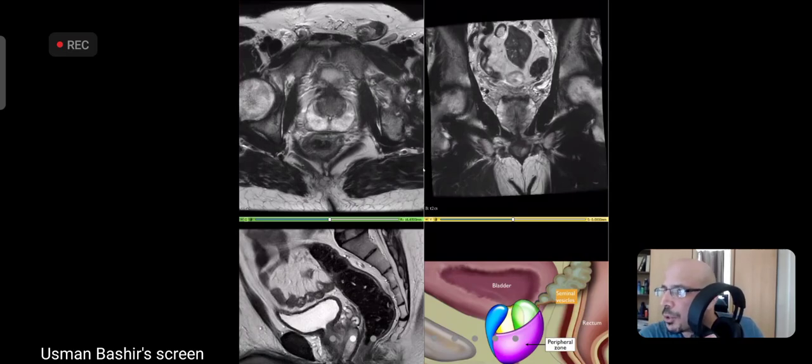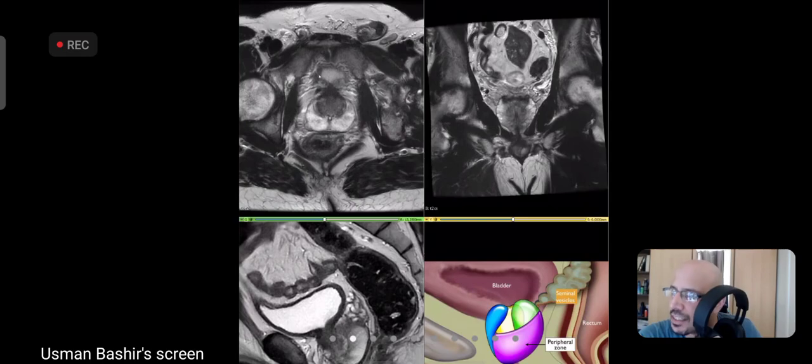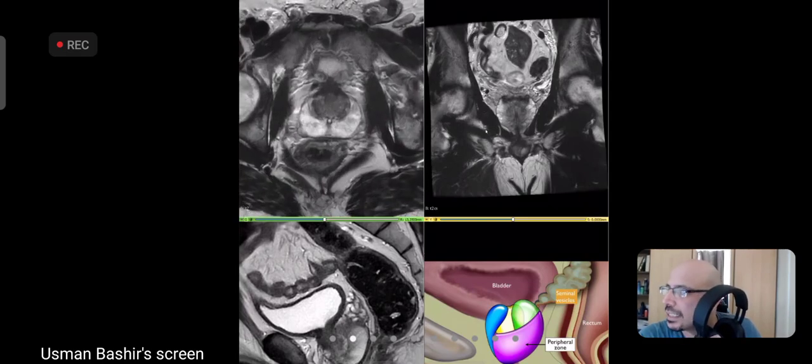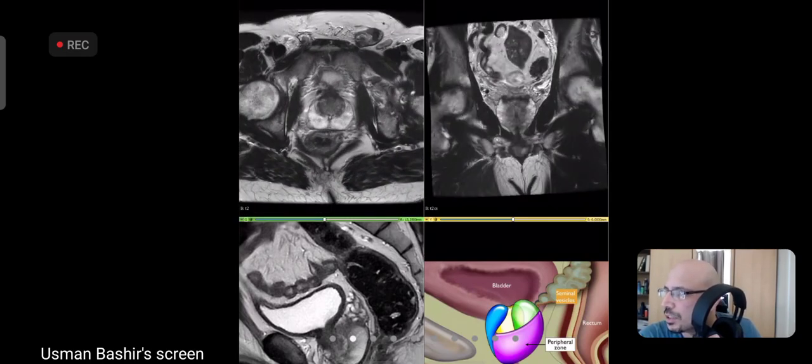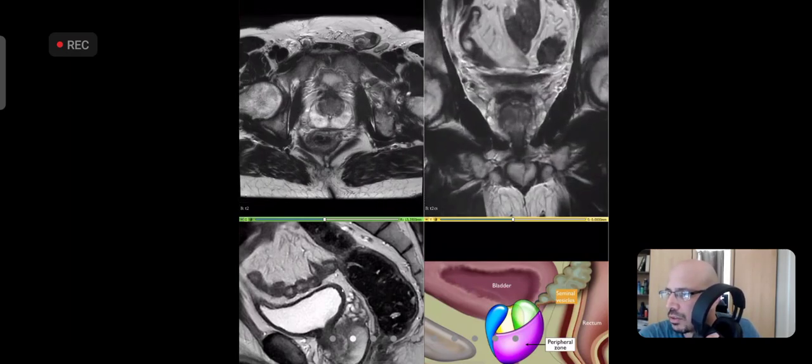Okay. So ये picture में ज़बरदस्त है. It's a pyramid-shaped structure. ये sagittal view है T2 weightage, ये axial view है T2 weighted, and this is a coronal sequence T2 weighted. Okay, मैं इनको zoom in कर देता हूँ ताकि और बड़ा नजर आए.